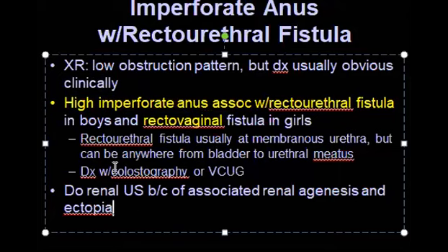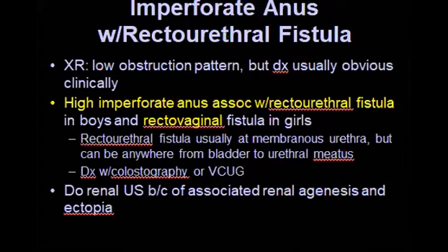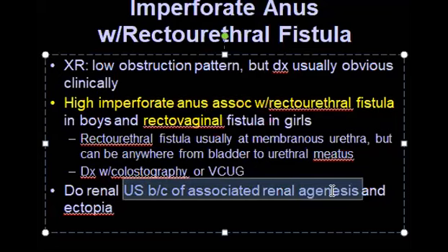You can diagnose it with something called colostography, as this one, or voiding cystourethrogram. Search for any associated renal agenesis or ectopia. So something good to know. You remember when we were in musculoskeletal? I like pediatric because pediatric is like revision of all the systems. So you think that this is like a review for our end sessions in pediatric in this system.